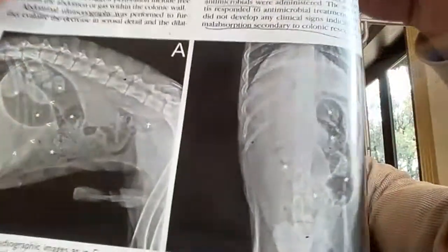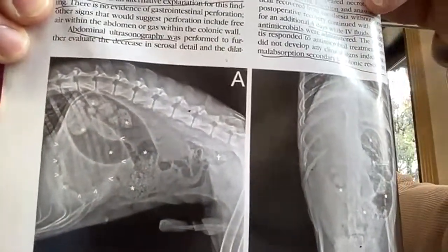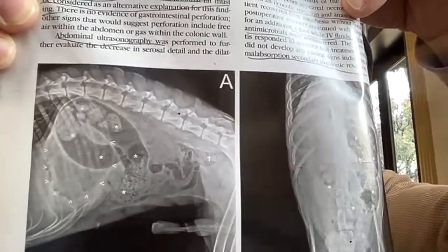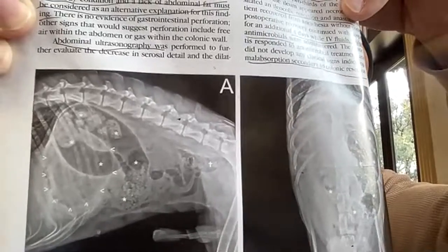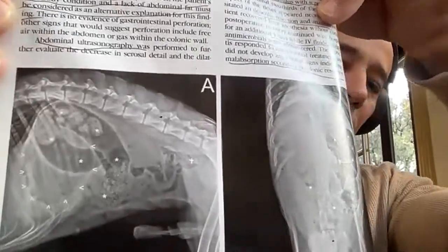the changes to the abdomen. So what it's showing there on side A is severe colonic distension with gas. The stomach is also distended with gas and fluid. And then they want to show there by the pelvis with little crosses that the descending rectum, colon rather, has been narrowed down acutely to regular size.